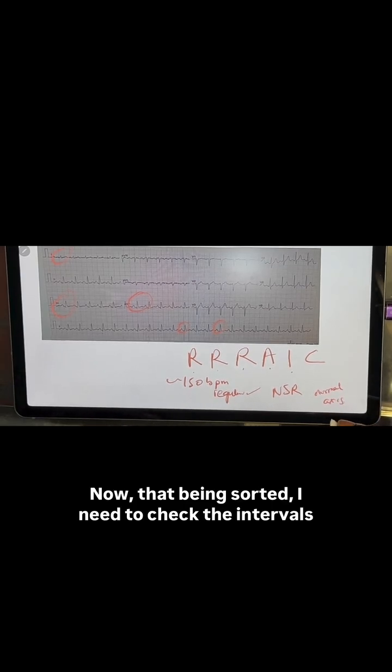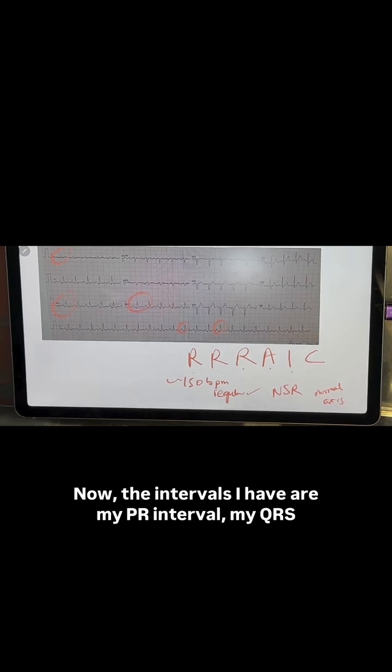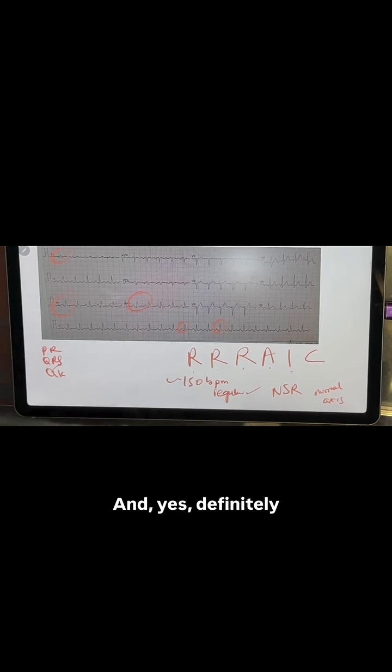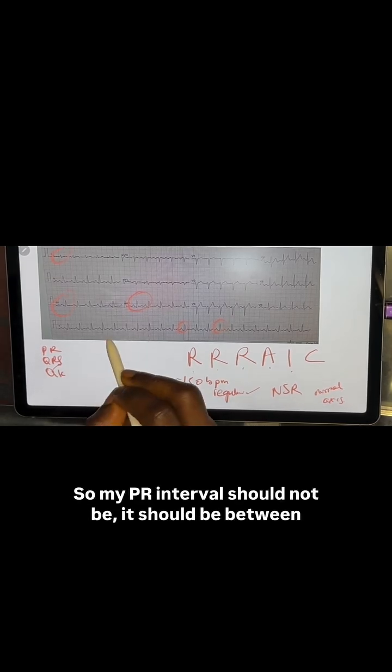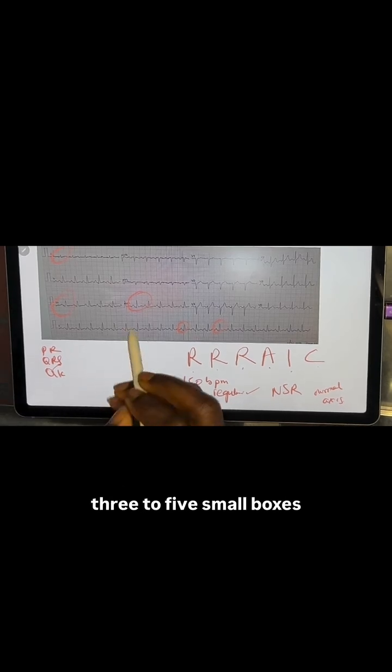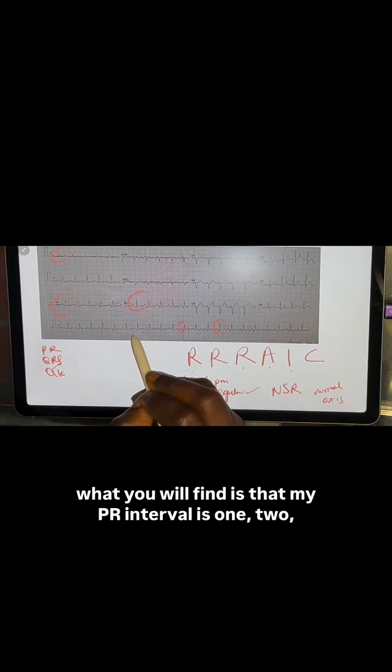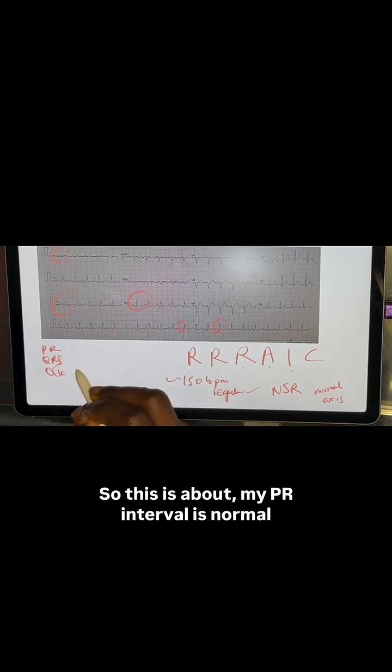Now, that being sorted, I need to check the intervals. The intervals I have are my PR interval, my QRS duration, my QTC. My PR interval should be between 3 to 5 small boxes. And if I check across my rhythm strip here, if I count, what you will find is that my PR interval is 1, 2, 3, 4. So my PR interval is normal.